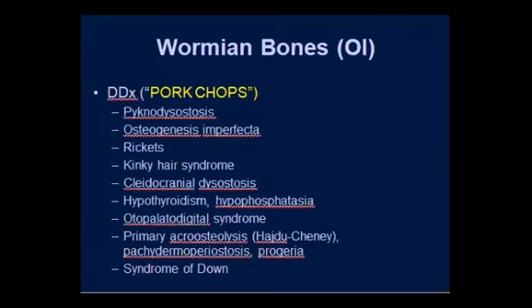Maybe we should mention this one, which is the abdomen of this infant has distension. Thank you. The source is the Oxford Textbook of Pediatrics about the wormian bones. Very nice addition.